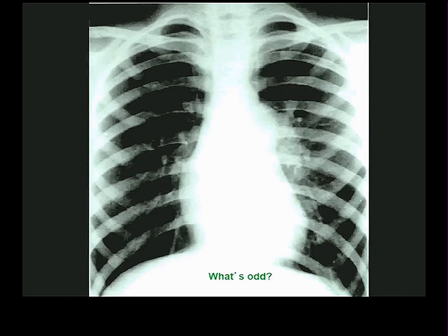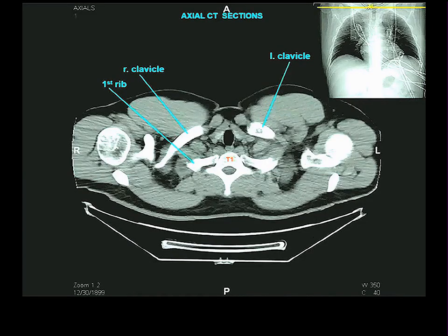Okay. So it's the blood coming out of the right ventricle, going through a narrowed pulmonary valve and being turned into a jet stream that hits the pulmonary trunk and pressure just blows it out, causes it to expand. So this, in fact, occurs as a result of a pulmonary valve stenosis. All right, so that's enough for cardiac shadows. All right, now we're going to do CTs of the chest.